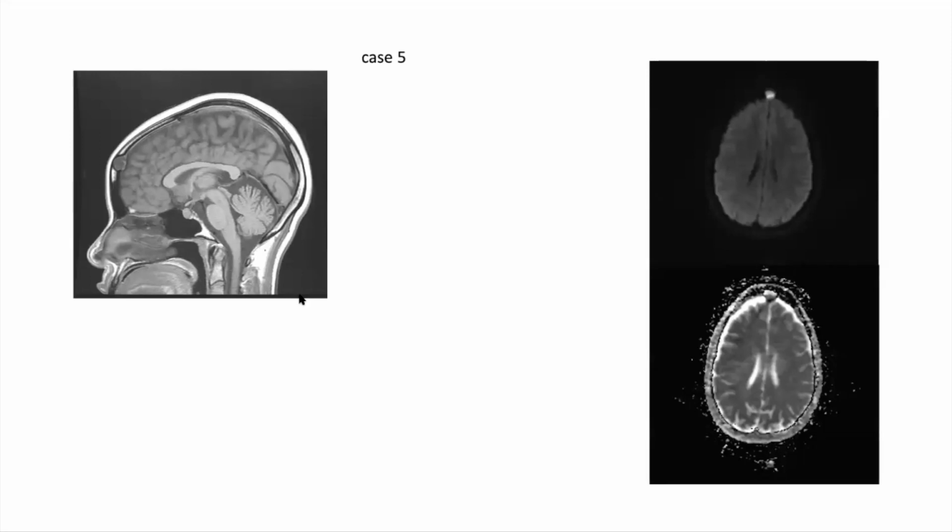And this is, I think, our last case. I want to show you this lesion. Here you can see there's an abnormality, interruption. Here's the diploic space marrow. And you can see this, some people will call these beveled edges. There's a lesion sitting in here.